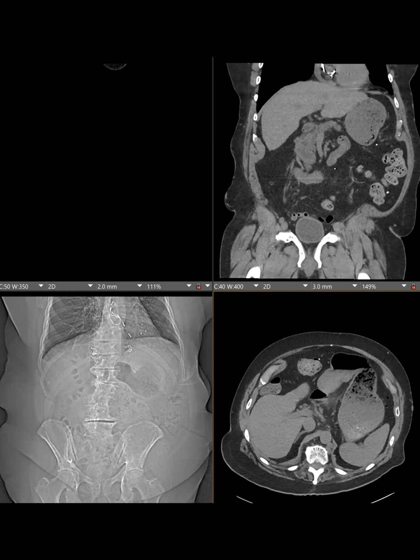So anyway, we bring it up when we see dilated bile ducts that appear to have papillary fronds that also might have a lot of fluid in them, like they look expanded with mucin. And yeah, this was a case where you also had invasive cancer, but they don't always have invasive cancer. There's like a 70% risk of harboring carcinoma in IPNB, right? I think IPNB of the liver has a higher risk, whereas MCN of the liver actually has a lower risk of invasive cancer than a pancreatic MCN.